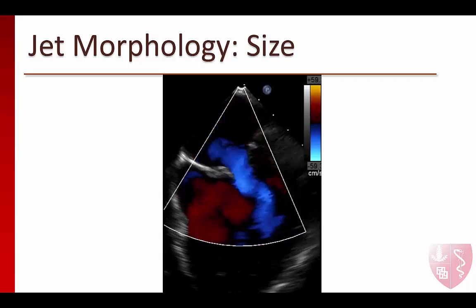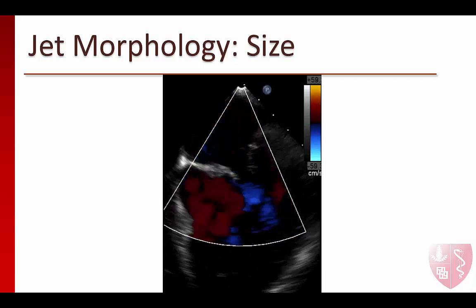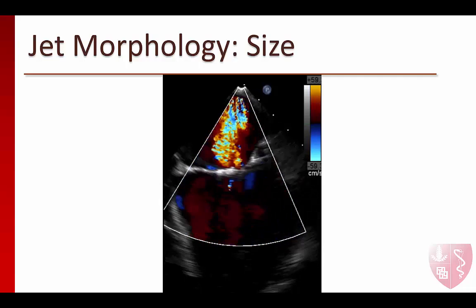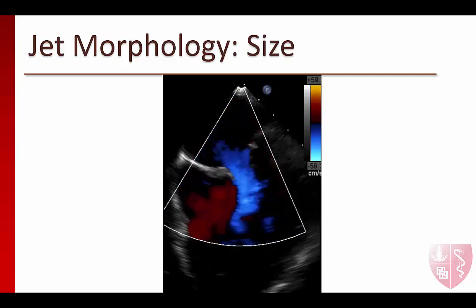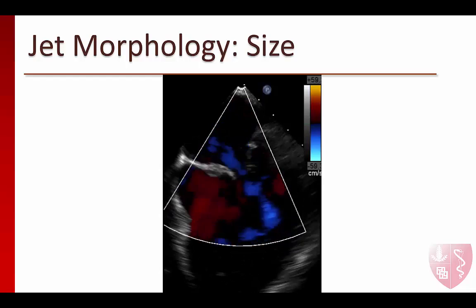This is the image we saw earlier of a dilated left heart, poor LV function, and dilated mitral valve annulus. Now that we place color flow over the valve, we see that our suspicion was confirmed and that there is indeed moderate to severe MR.